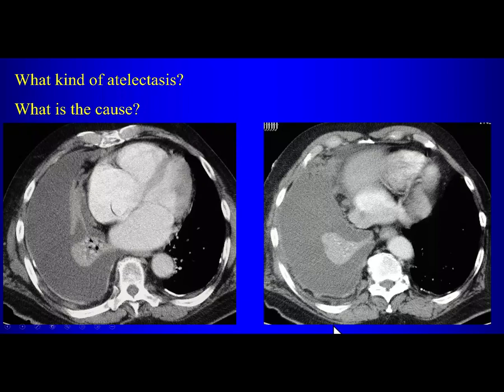Or it could be a tumor. Well, first you're going to have to come down on one or the other, but has the patient had asbestos exposure? That's to be determined in the history. And what about on the imaging? There's a calcified pleural plaque on the left. Okay. What about on the right? There's a smaller calcified pleural plaque on the right. So do we think the patient has had asbestos exposure?